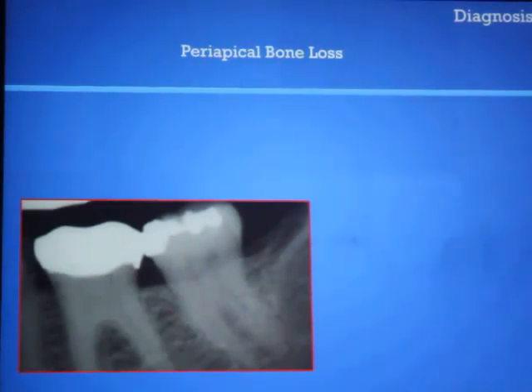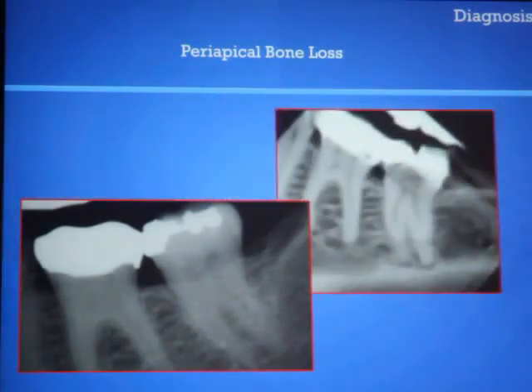So in the earlier case, we had to toss a coin and pick a tooth to decide which one was giving the trouble. We didn't have a conebeam CT machine there. Fortunately, we have a conebeam CT machine here, and we just do a conebeam CT, and actually we can see there is a very initial bone loss at the distal and the mesial root of 7.